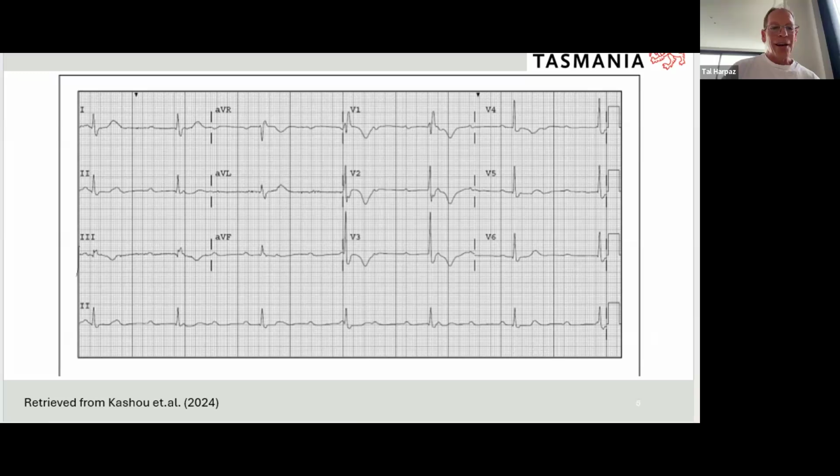So it's 30 of those small ones. Yeah, 6 of the big ones. So we want to count out these big lines on the actual paper to be able to go, okay, well, there's where my 6-second interval is.